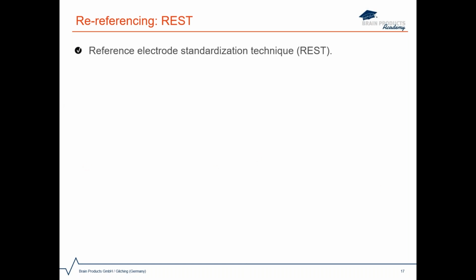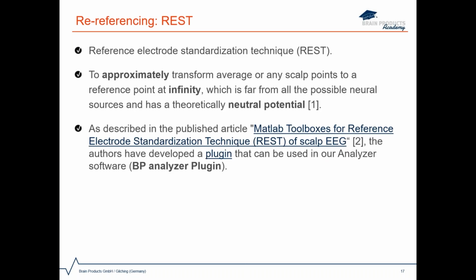Analyzer doesn't have a dedicated module for performing the REST method, but thanks to the authors of this article, a plugin that integrates the REST method in our Analyzer software has been developed. Specifically, the plugin makes use of Matlab transformation in a history template.